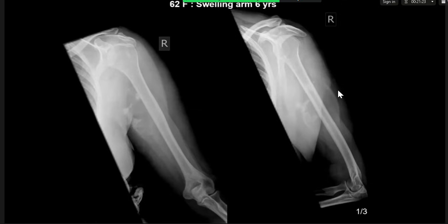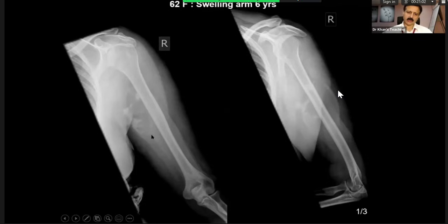I'm told that it's quite long-standing. If it's been previously investigated, I think it would be a good first step to review any prior images to see whether it's got larger. Otherwise, further investigation is necessary because the calcification might only represent part of the lesion. And what do you think it can be? Do you see this? What do you think?